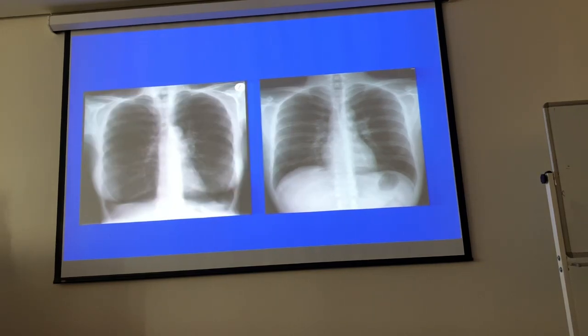Now, which one is normal? The right one is normal. So what's going on the left? You have flattening of the diaphragm. You have flattened diaphragm, tubular heart, somewhat expansion, but there is a specific thing I want to show in this one.